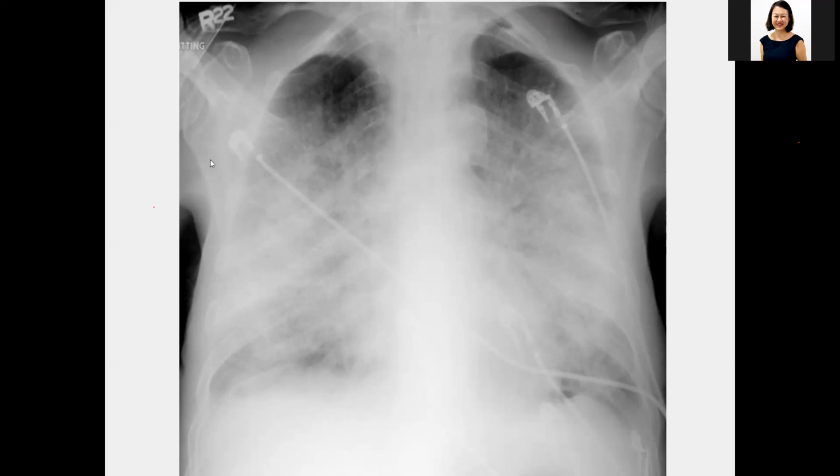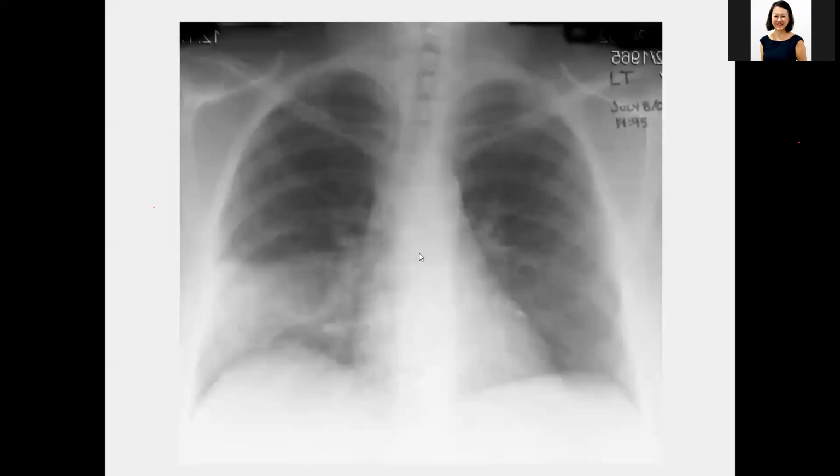Somebody said, can we say bilateral more than right side? I don't see why they keep on hopping on. Where is the consolidation? You see, I don't see any consolidation. And here? Then the thing is, you see, if you look at your pathology, right?